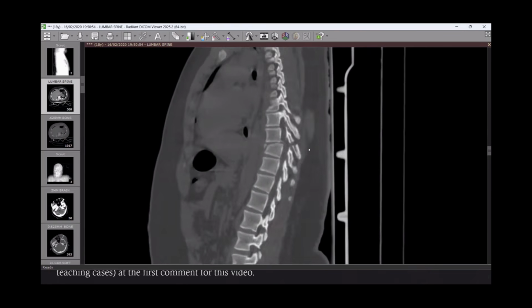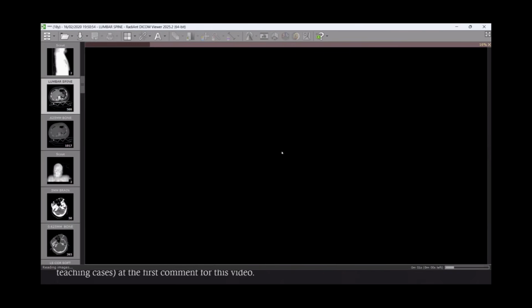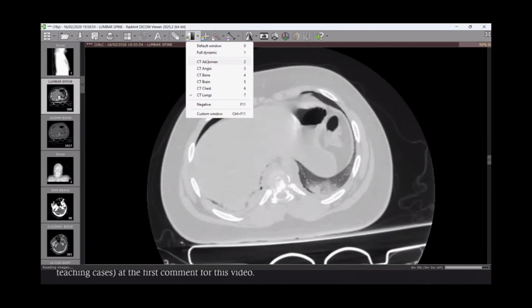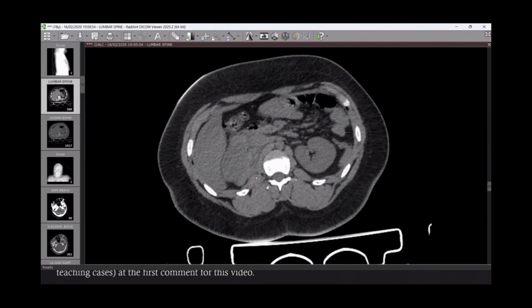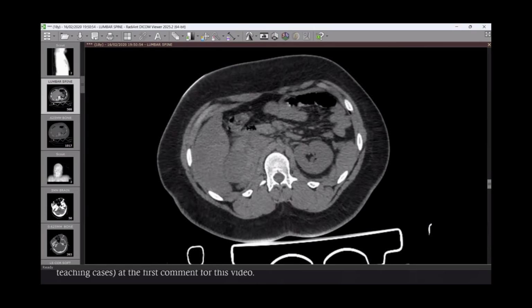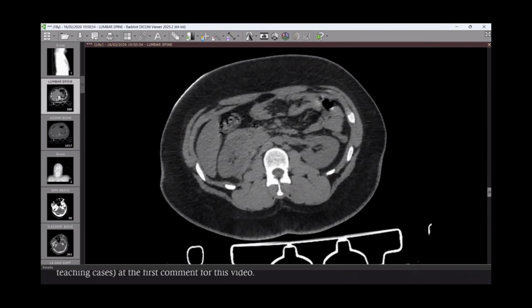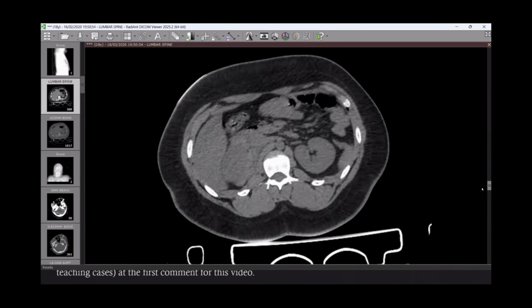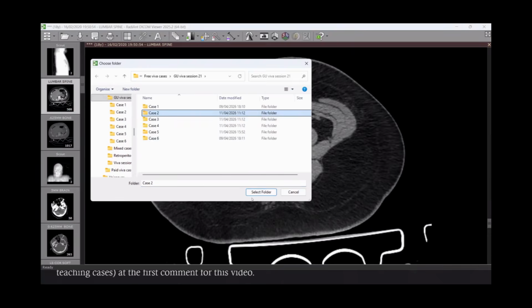Anyway, we will not go in depth on this one, but again, I need to focus on the abdomen. Here in the abdomen, we have perinephric hematoma extending to the adrenal gland region, maybe adrenal gland hematoma, as you said, and we have vertebral fractures, and we have lung injury as we described before. Okay, that's fine. Can we move to the next case?